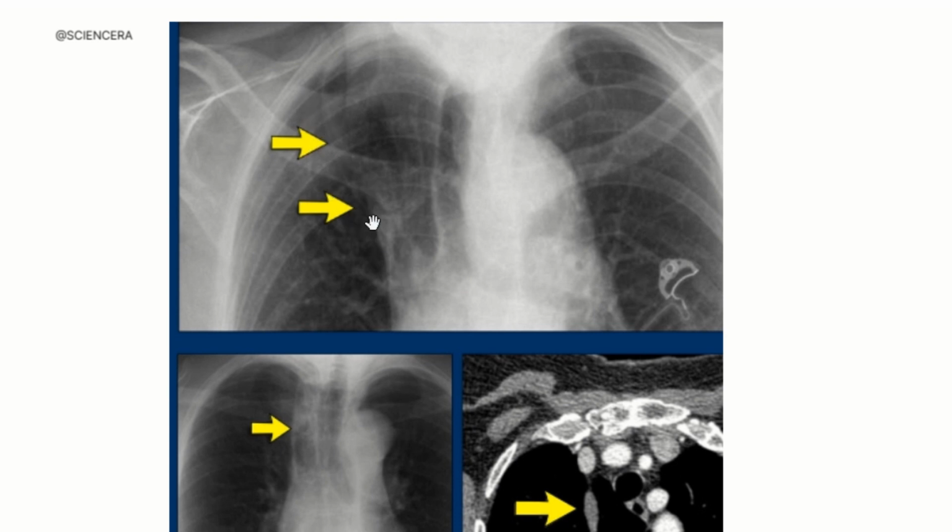So this is your azygous vein, and it is cutting through the upper part of the lung, and it is creating a deep fissure in the upper part of the lungs. So what does it mean? We can say that on a chest film or the chest X-ray, it is seen as a fine line that crosses the apex of the right lung.